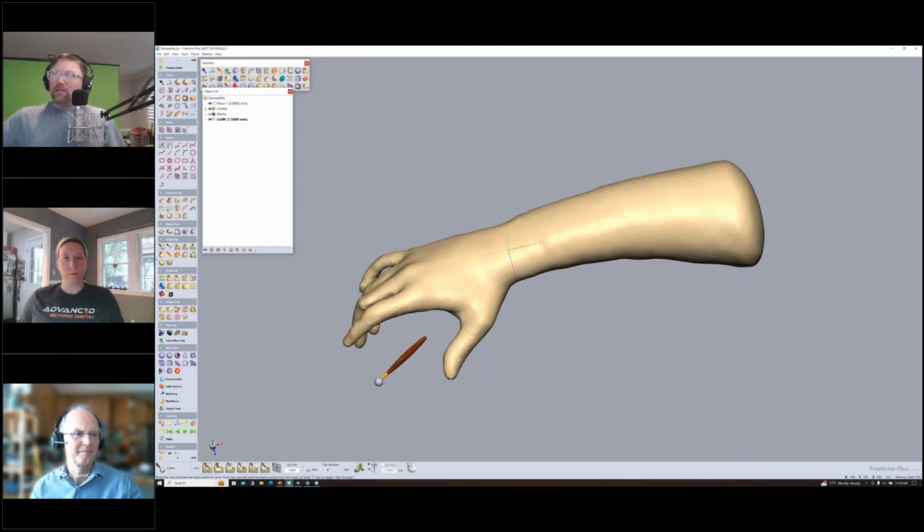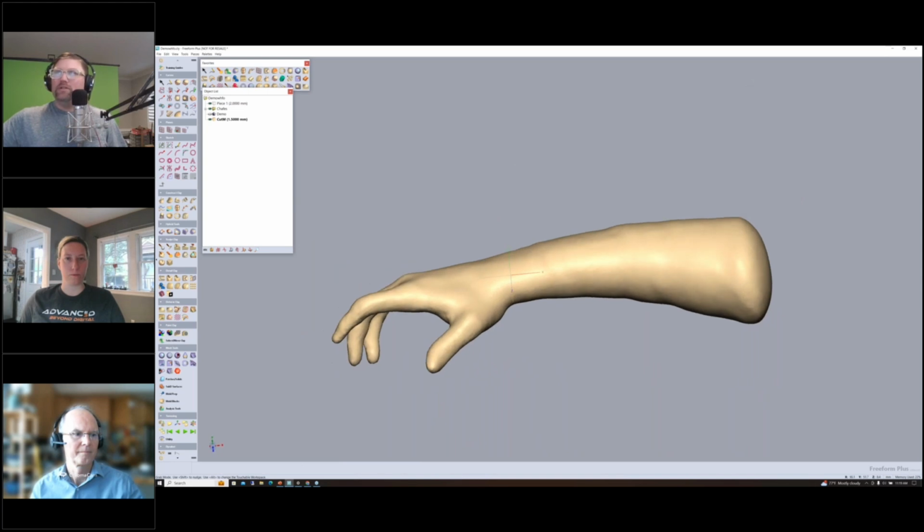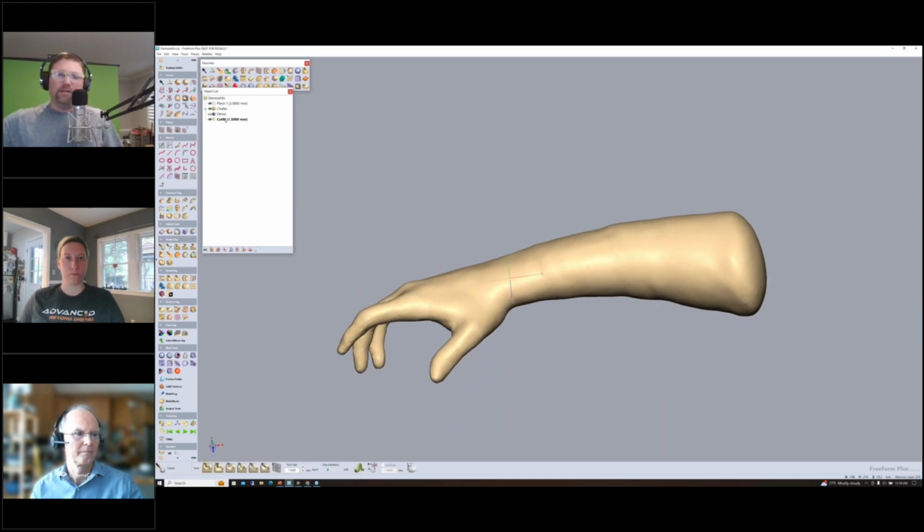So we've got this clay model, and I'm just kind of looking around seeing what I need to do. I have labeled it because Katie has taught me to label things, because now that we work together more and more, it's important to know what each other has done. So we try to keep this tree as clean as possible.